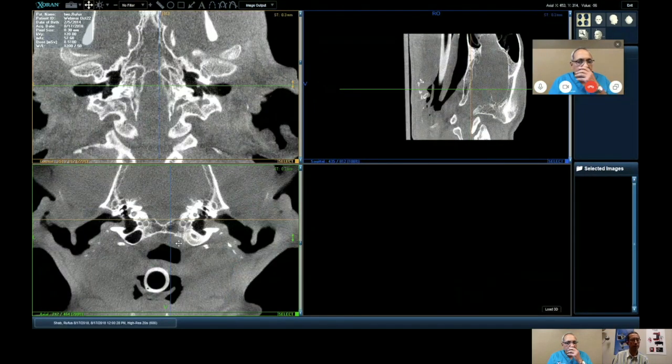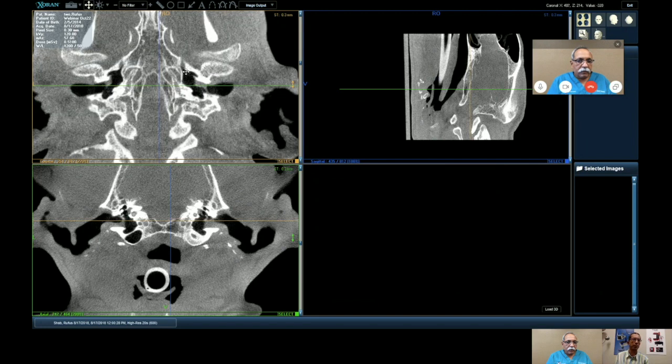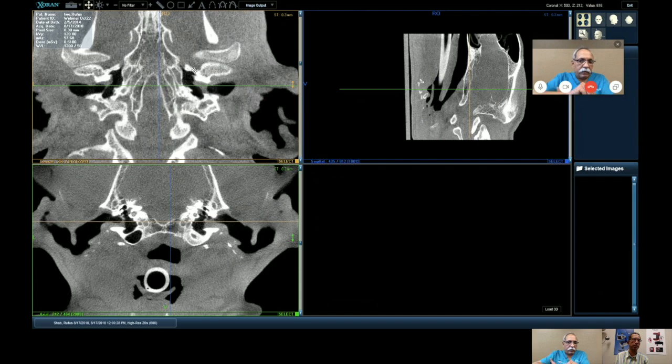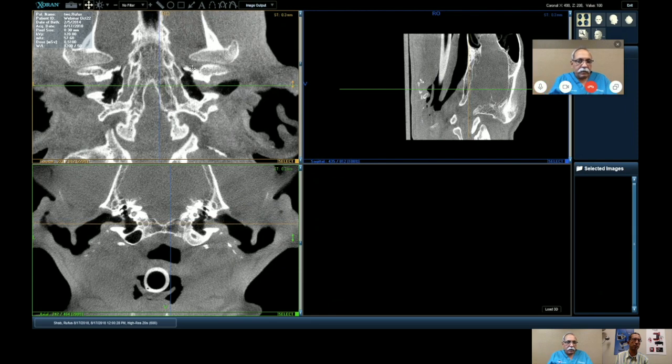So here you can see the eustachian tube right on the dorsal aspect of middle ear space, right there. If you follow that, scroll, you can follow that line. Keep scrolling. It will go all the way. We might want to pull the, yeah, there. Okay. Keep scrolling.